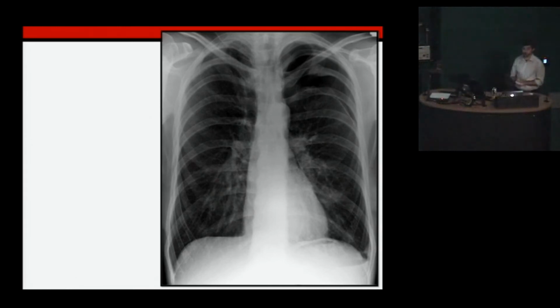Okay. Left pneumothorax, apical. Okay, so do we all see this? So it won't be as hard as this, but it might be, this would be reasonable. So the clinical information says that someone's fallen from a height, trauma to the chest. The reason I put this up is that, like with an ECG, you're looking for that abnormality. So you're not going to get this story and then be given a COPD patient, because it doesn't fit. The clinical scenario is of someone where you're going to be looking for a pneumothorax.